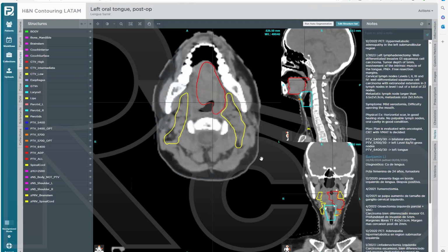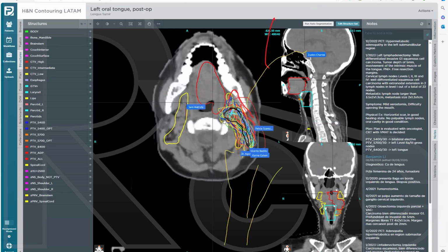Can everyone draw level 2 for me here? Thank you. And so this is common. You get all experts, and everyone will draw something different. That's what happens. So let's erase, and I can draw.